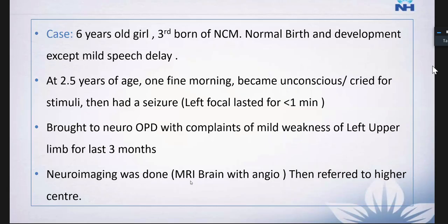In a case of dysmyelination or leukodystrophy, the white matter is much brighter on T2 weighted images, and they are usually more T1 hypointense as compared to hypomyelination. In dysmyelination or leukodystrophy, you will see normally myelinated areas, especially when it is not global, so that will be a clue that it looks like more of a dysmyelination rather than hypomyelination.